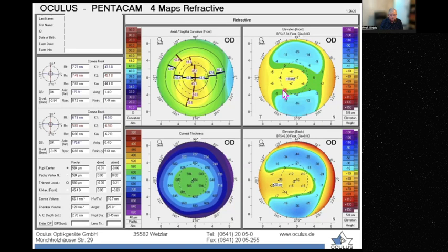Now, don't look at the shape. The tongue-like extension is no longer used. It shows just that the cornea is distorted, maybe because it's a large angle kappa. When there is large angle kappa, you will find this shape, although the cornea is symmetric and fine and normal. So the tongue-like extension is not a risk factor.